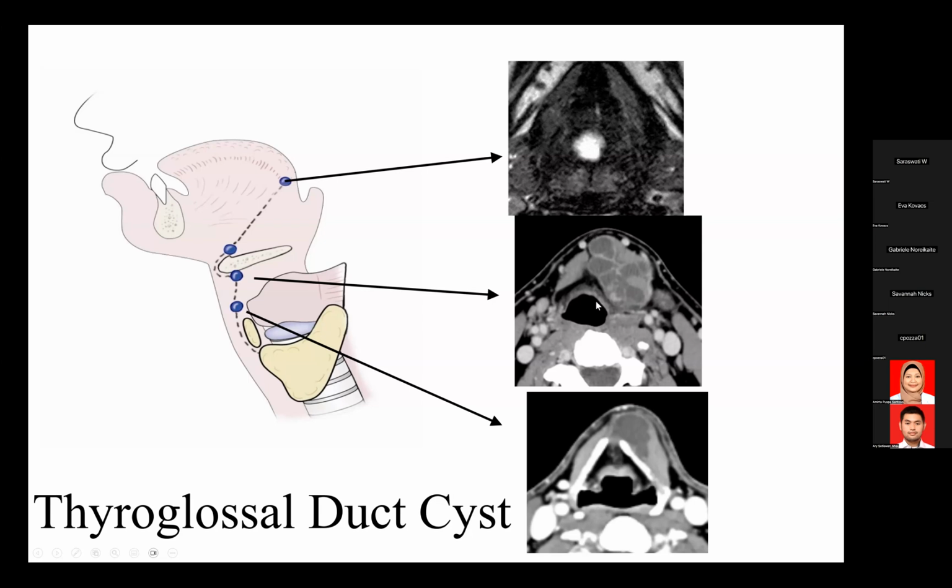Well, if you just saw this, I've seen this given different differentials. I've seen this called maybe epidermoid, maybe a dermoid, maybe a neoplasm. It's possible if you're in an endemic area, someone could call this cysticercosis or tuberculosis and so forth. But on the other hand, what this represents is another thyroglossal duct cyst.